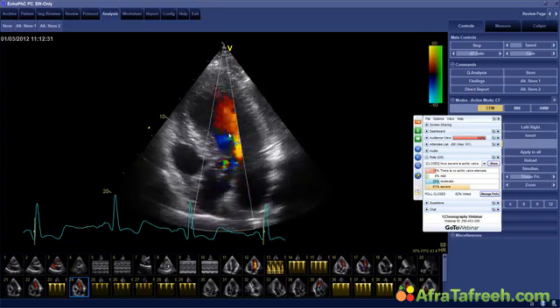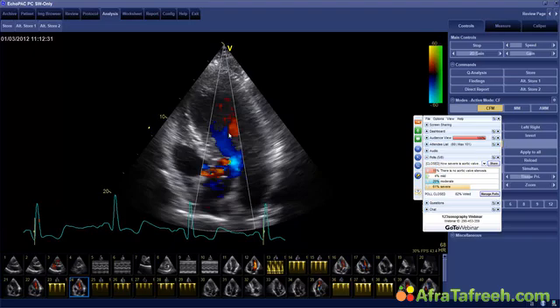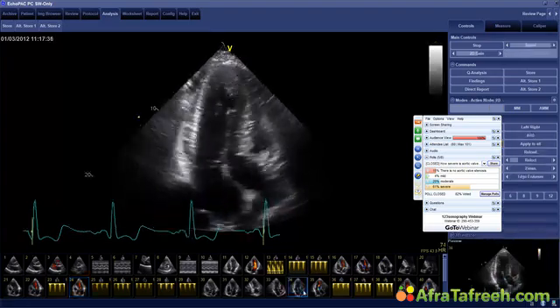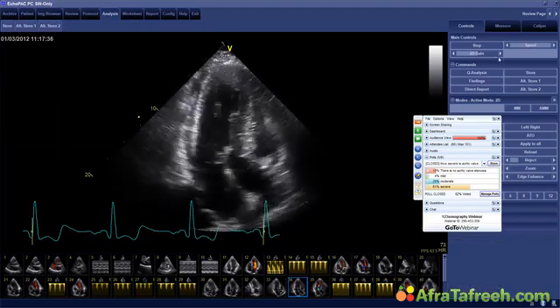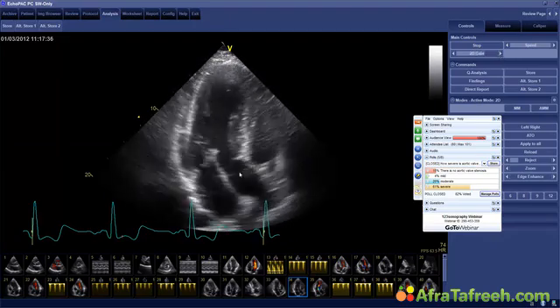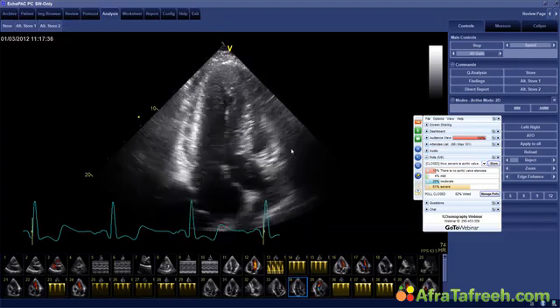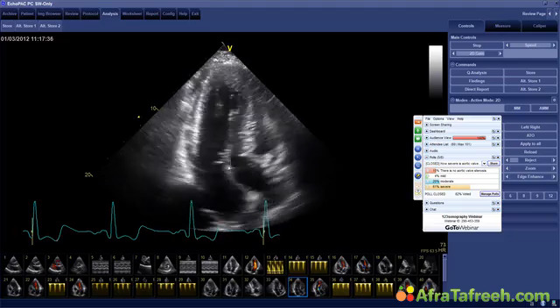Amjad, you have a very good point there. I will tell the rest of the people what you saw in a minute. Here you can see the outflow tract, and there is a gradient here. Ferenc, you have also made the correct diagnosis. We see here that there is an obstruction of the outflow tract caused by the mitral valve. But as Ferenc and Amjad also noticed already, there is another problem, also located below the aortic valve, and that is a membrane. Do you see the membrane here?